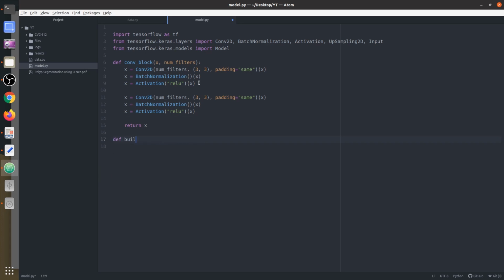Now we will build a model. We know the size of the input is 256. Num filters is equal to 16. So filters in the unit are 64, 128, 256, but I'm just reducing accordingly because for this demo we need to keep it short so that it can run and train in this video only, because if you increase the number of filters, the training time will also increase, and you need to set them accordingly for your requirement. For my requirement I feel these are sufficient, and later we'll see in the training if we have any problem we'll just change them.